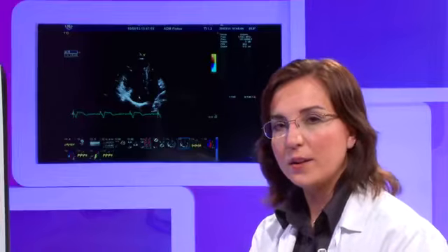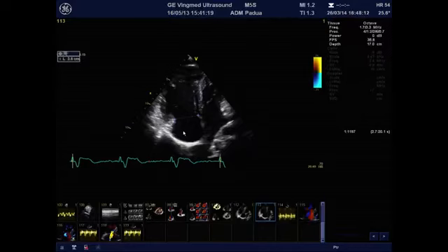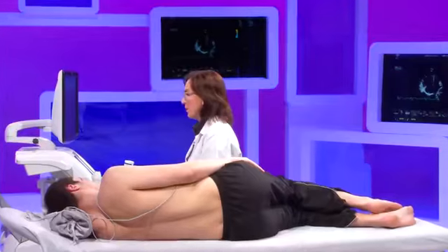As you know very well, the tricuspid regurgitation, if there is no problem of the valve, has a secondary mechanism. It is related to the tethering of the leaflets, the traction of the papillary muscles due to a severe enlargement of the right ventricle, like it is the case with this patient with Fallot. Or there is an increase in the pulmonary pressure.